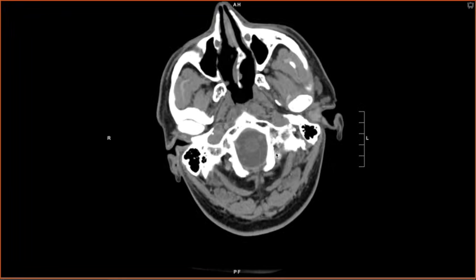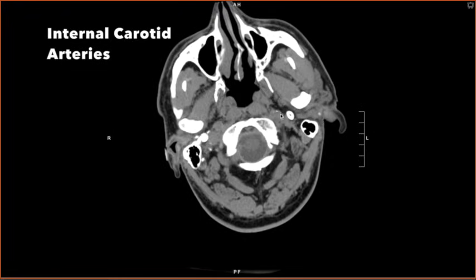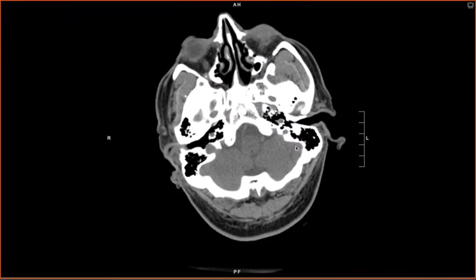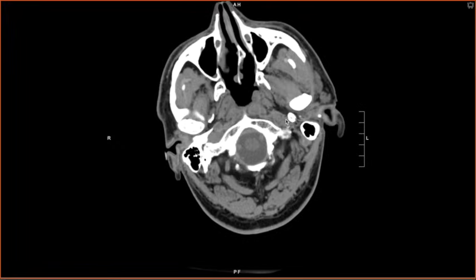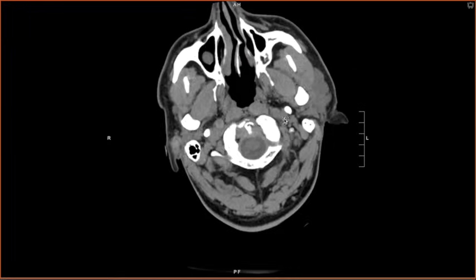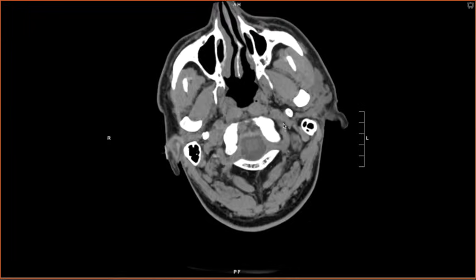And then lastly, but definitely not leastly, I look at the carotid arteries beneath the skull base. Okay? The carotid arteries beneath the skull base can be hard to find on an individual slice, but the best way to find them is to find the carotid canal itself here and scroll inferiorly from that location, and naturally the carotid artery can be followed beneath that point.